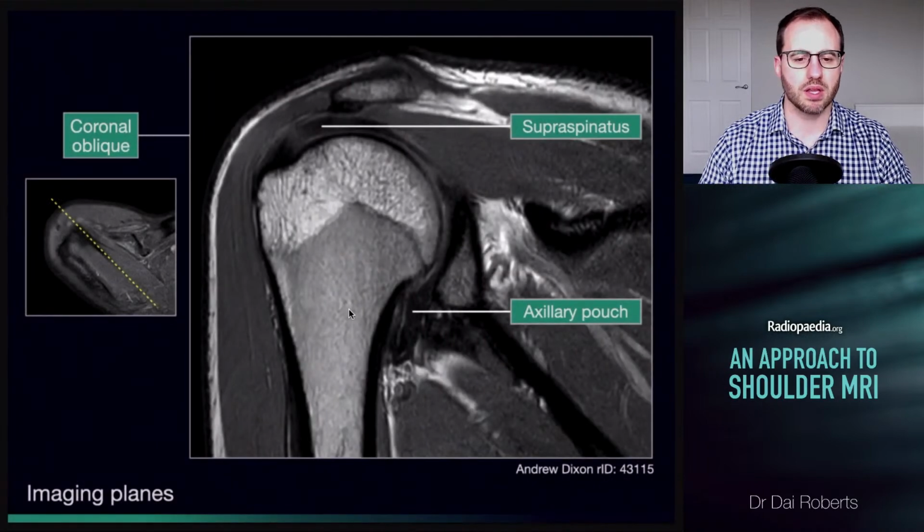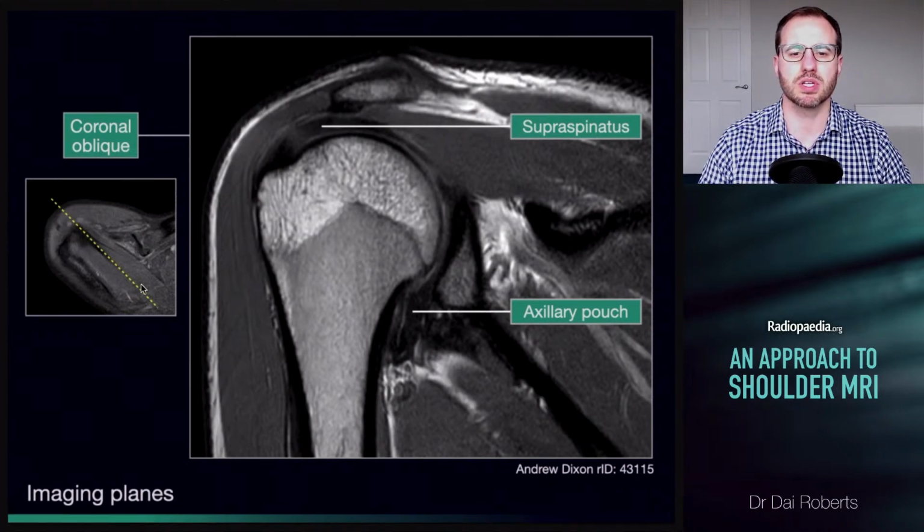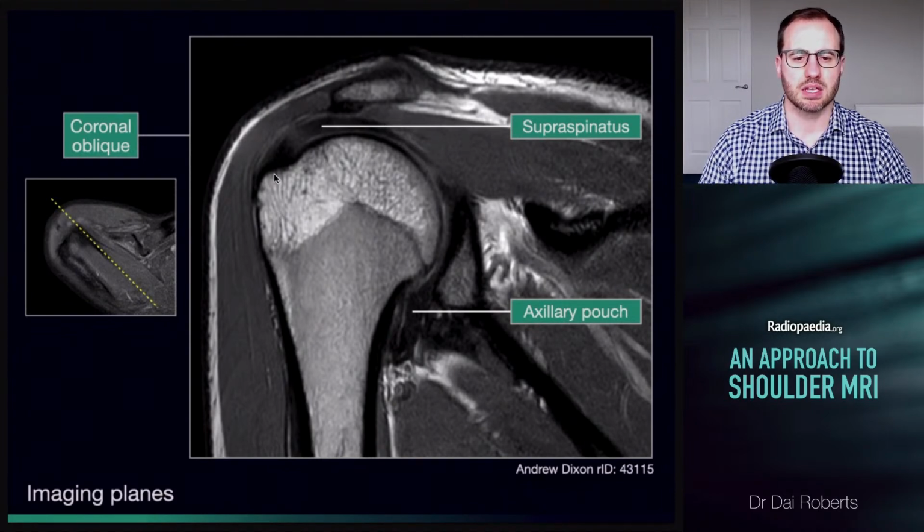So in a well lined up coronal oblique sequence, you should see a reference point line perfectly parallel to that supraspinatus tendon. And we want to do that to really best assess for tendinosis and partial thickness tearing. And if the plane is slightly off what we want, more oblique or less oblique, it really makes assessment of tendinosis and tears much more difficult.